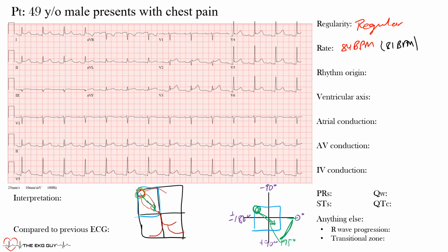So what we now have to know is that because that wave front is moving in that direction, it's a depolarization wave. If it moves toward the leads in that position, we should see upright positive P waves. So we have to know what leads are there. Lead 1 sits here, lead AVF is down here, lead 2 sits here, and then lead 3 is over here. In our horizontal plane we have V4, V5, V6, and so forth. And we have AVR that sits here, and AVL is up here.